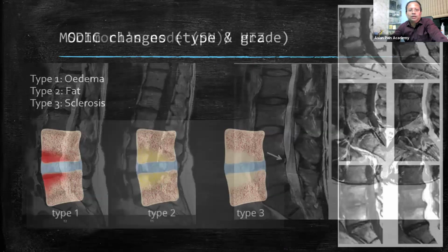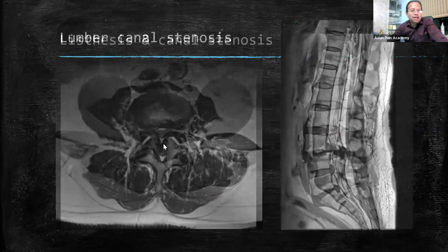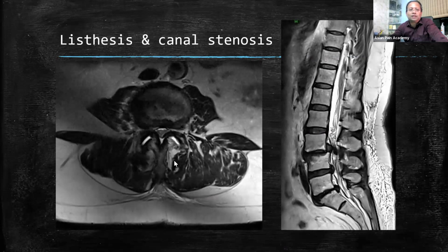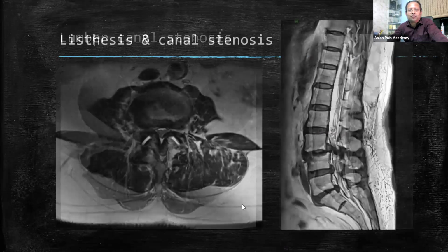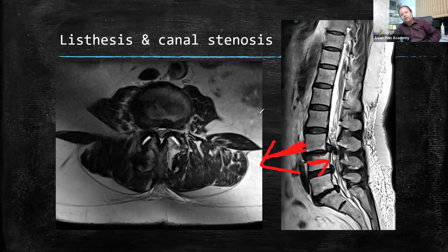One more important thing. Okay, lumbar canal stenosis I talked about. This is the lumbar canal stenosis. Here, the canal is compressed by the disc, but the canal will also get compressed if the bone is moving. So this bone has come anterolisthesis. It has come a bit forward. This bone is in the same place, but the upper one has come forward. So here, the bony fragment and all, everything has made the spinal canal compressed.